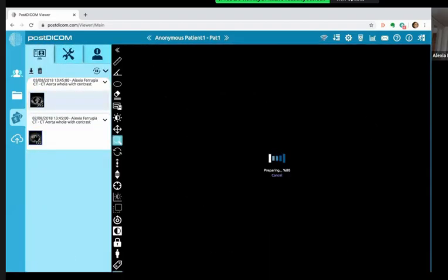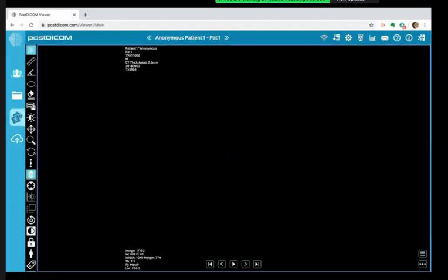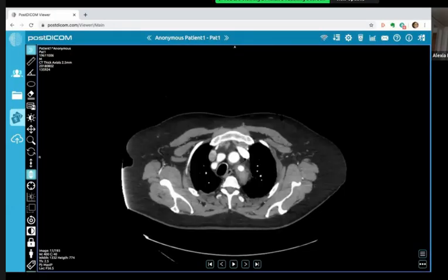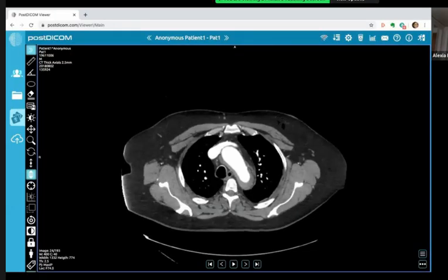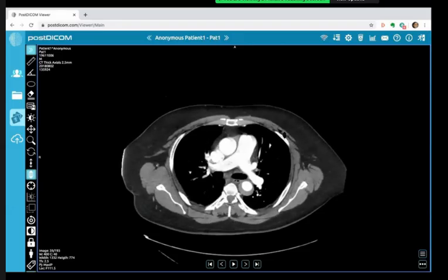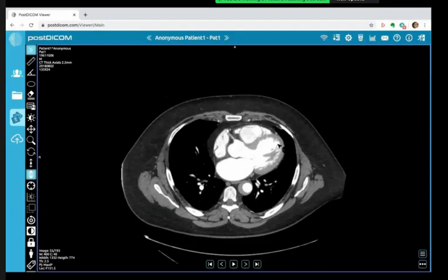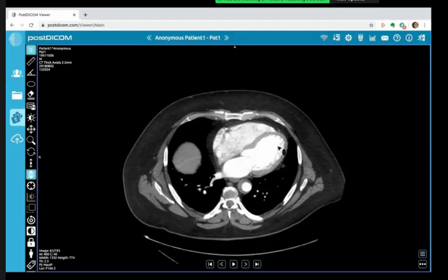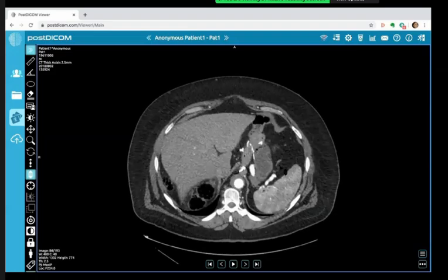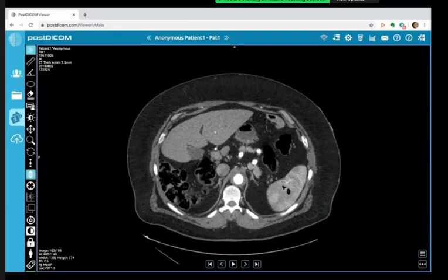I wasn't sure it was projecting very well on your end. I'll show you an aortogram now, an arterial phase scan, which confirms your suspicion. Yeah, there are quite circumscribed mural areas of hyperdensity, not having contrast there. So within the wall is thickened and there's a hematoma there.